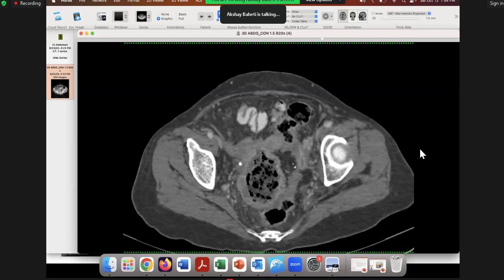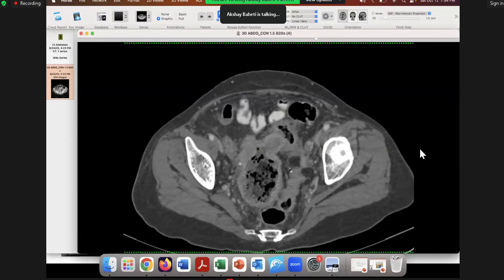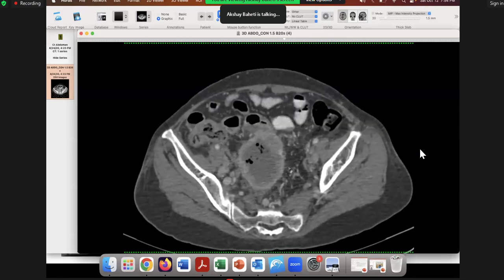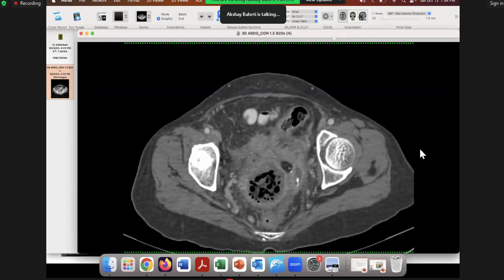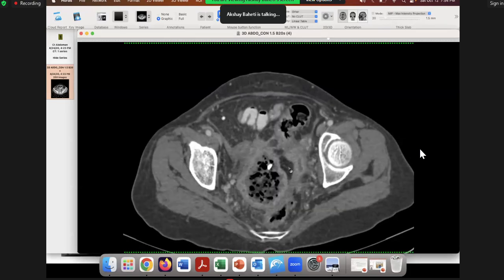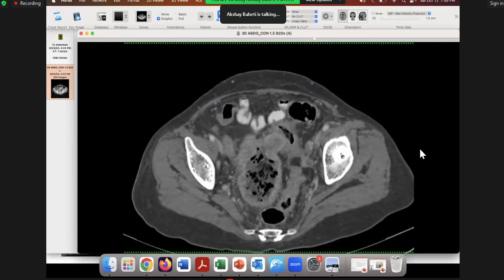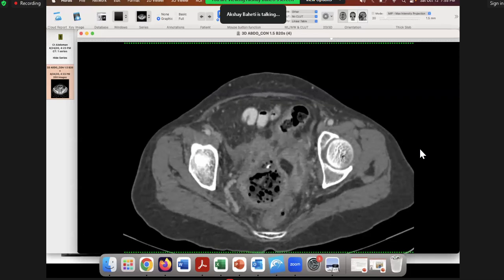There's a tumor or some mass somewhere which is involving the bowel. It doesn't look like a primary, in the sense that it doesn't look like a lymphoma or adenocarcinoma arising from the bowel. So a GIST is one thing this could have been. GIST can be exophytic from the bowel, and of course it can fistulize with the bowel. But when you see ossification, what is the other thing which can develop in the pelvis, which has bone?